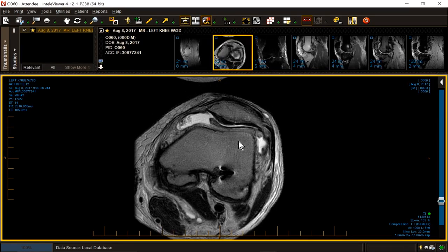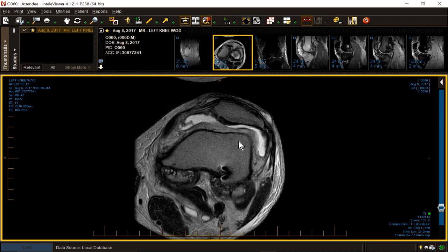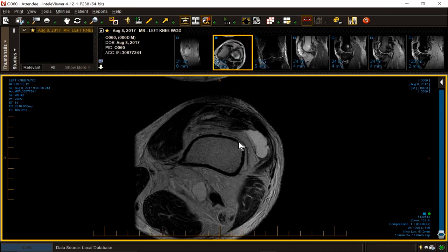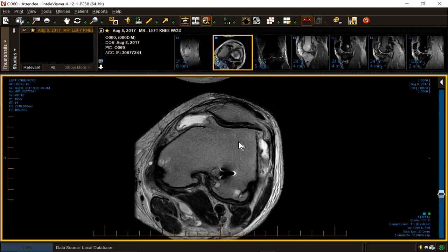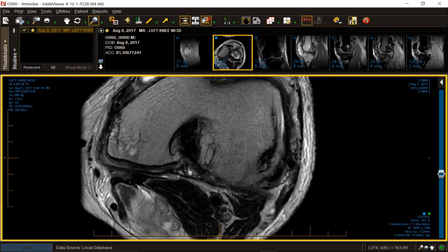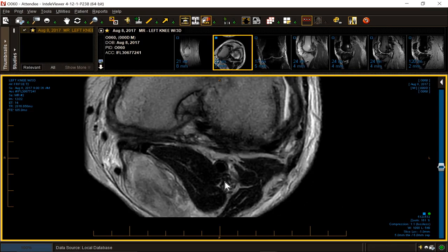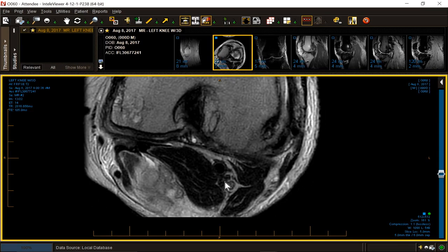He has the dreaded hospital-based imaging procedure, which leads you down the wrong trail. They do an ultrasound for his swollen calf, and they say he has DVT, deep vein thrombosis. The reason they said that is they couldn't see a vein. Here's his artery. There's his vein. Why couldn't they see the vein? Oh, at some point it probably did have a DVT. It's shrunken into a scarred, small structure.